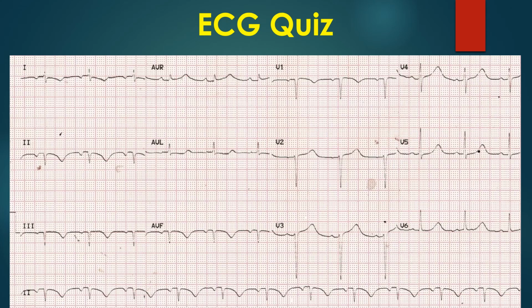Now coming back to the initial observations, what looks like an inferior wall myocardial infarction with a rhythm other than sinus rhythm with abnormal P wave axis can occur when the right arm and left leg leads are reversed while recording the ECG. Simplest way to check for lead errors is to take a repeat ECG under direct observation and compare the tracings. In this case, inferior wall infarction pattern and abnormal P wave axis reverted in the repeat ECG.